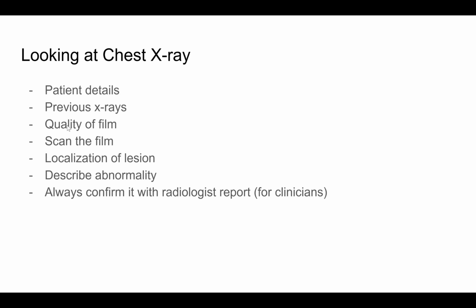Then you can see the technical quality of the film. The first step is to scan the film, see if there is any abnormality you see, and never ever stop on one abnormality. Always scan through the whole chest x-ray to determine if there is any other.